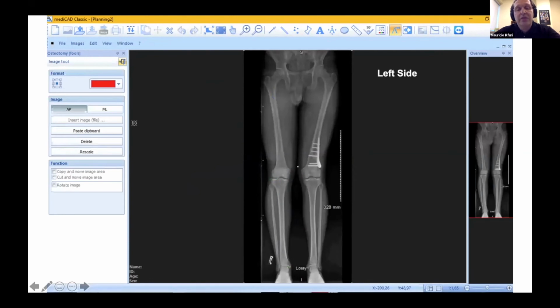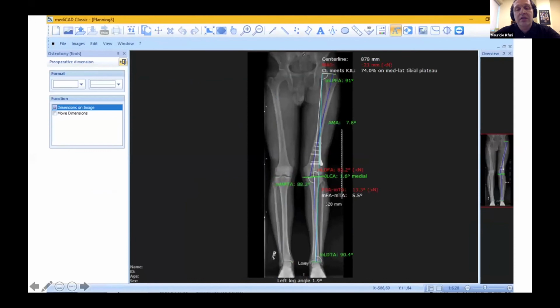The patient had a surgical procedure before, and you can see this patient has a valgus deformity, and the lateral distal femur angle after his fixation for the distal femur fracture was 81.2. So this tells you this is a red angle. This is not a normal angle. This is where the valgus is coming from, the distal femur.